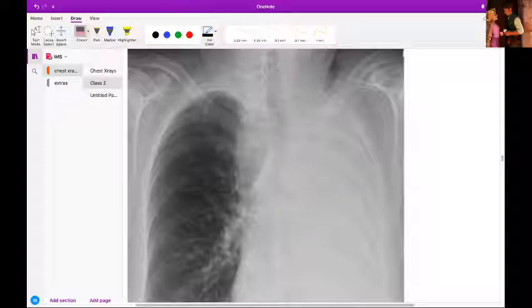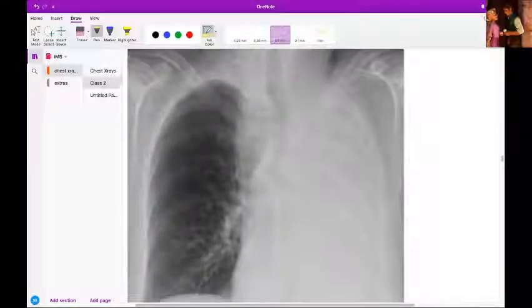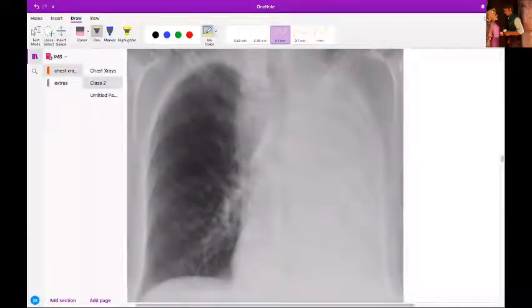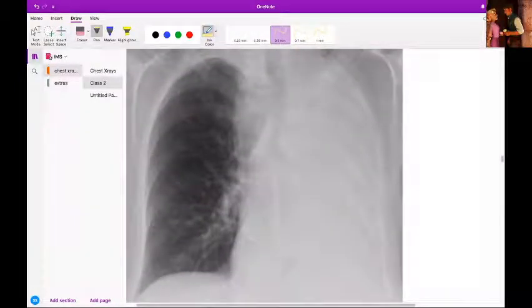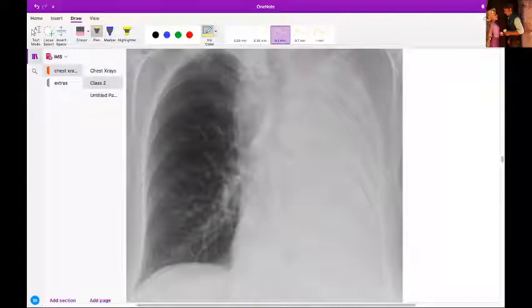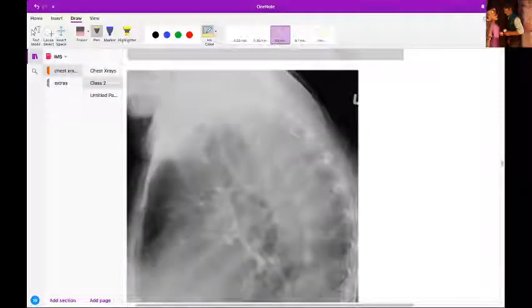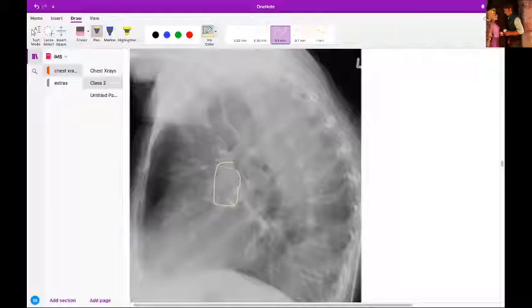I don't know the QID. Why would I remember the QID? But I'll check. I have the X-ray of that one, I didn't put it over here. How did the patient not notice? Anyways, this is the thing that's causing the obstruction in that lateral view.